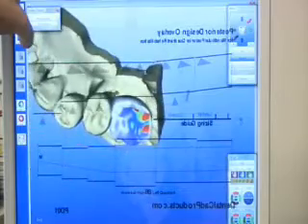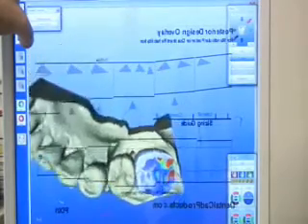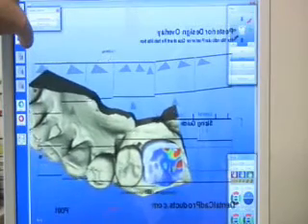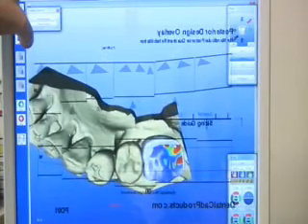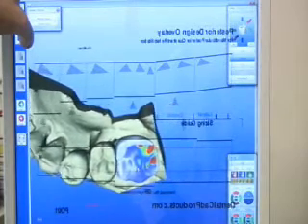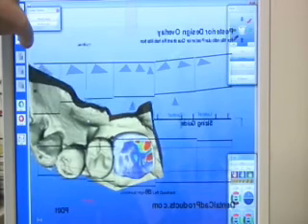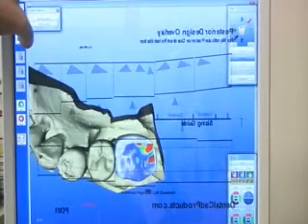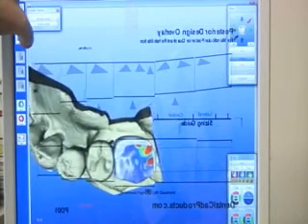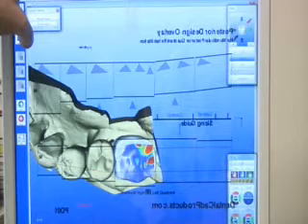We will now rotate, so we look from the occlusal, move the virtual model down to the second set of lines, so we can start evaluating the buccal lingual width, cusp tips, central groove, and buccal extent of the restoration. We will fine-tune our proposal with the tools available to us in the lower right-hand corner.